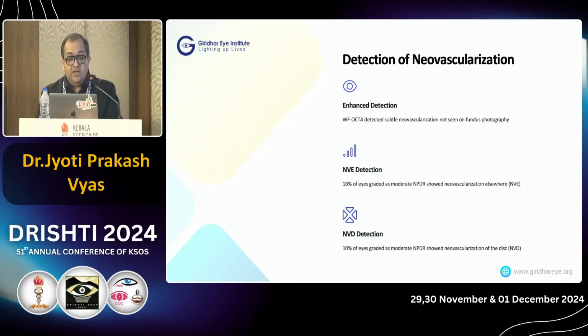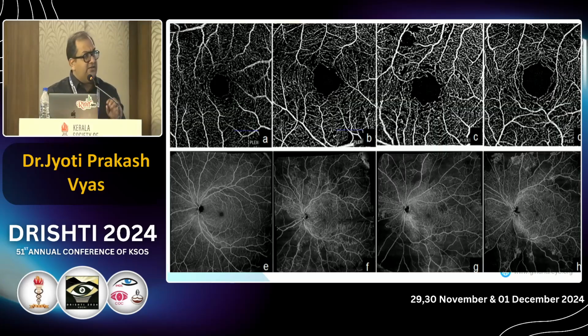And they also added the element of looking at neovascularization as compared to wide field fundus photography. All put together, if I read through it, you will not be surprised. If you look at it, it is very visually striking. To the left of your screen, you can see this is mild NPDR, and as you progress toward the right, it's proliferative diabetic retinopathy.